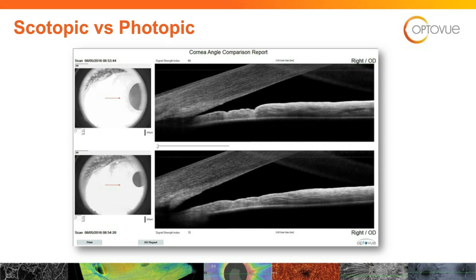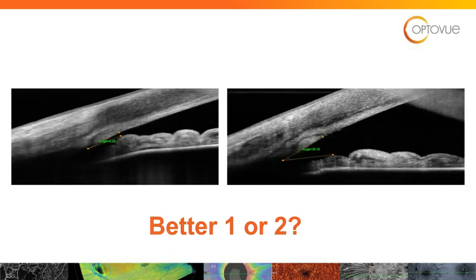exceptional job. Here's another example of a patient that we ended up doing cataract surgery and goniosynechialysis to try to open up that angle, and open it up we did. So that was a really successful case there.